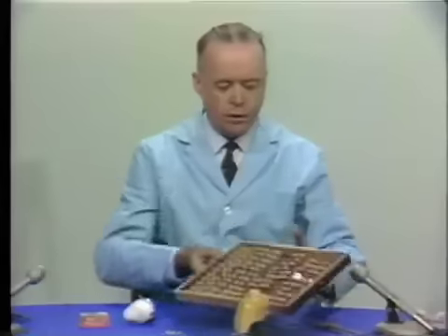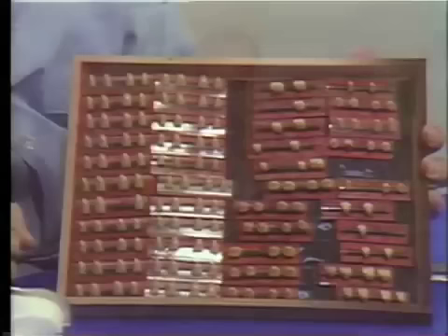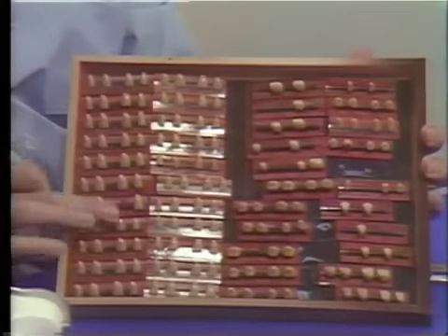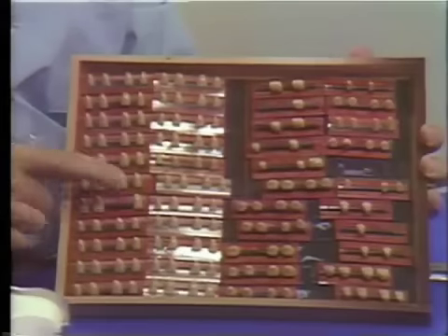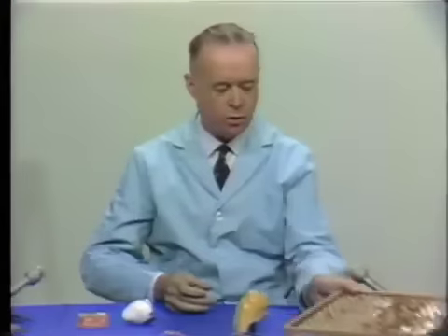Similar types of mold guides are available for use in this situation, in the full range of molds that are available for incisor teeth, bicuspids, and molars, and so on. And these are selected in the usual manner. The code number is noted, and along with the shade, one can then order the facing which is required.